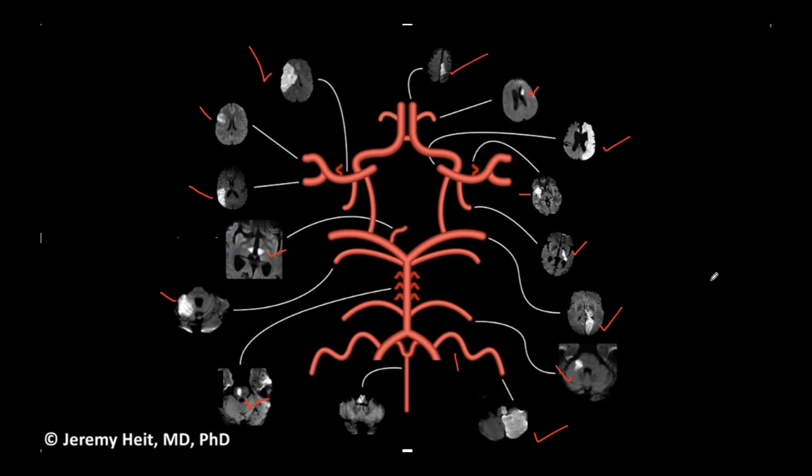How about this one? ICA. AICA. Right. Anterior inferior cerebellar artery. And the last one, this one. Now I'm at the base of the basilar occlusion. This one is actually in the cervicomedullary junction going into the cord. Anterior spinal. Anterior spinal. Okay. If not, we'll have to do the whole talk again, and I didn't want you guys to sit through that. Awesome. So I think we did a good job.